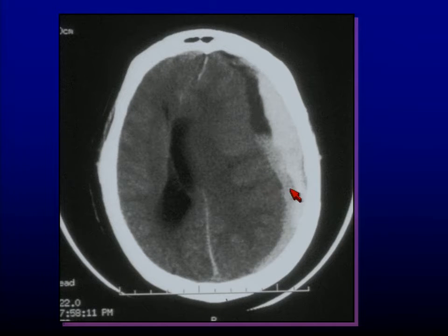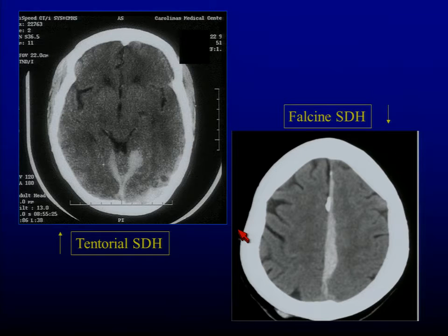But then they fell again, and they now have an acute subdural on top of it. So is their blood subdural, both acute and chronic? What's it doing? Well, unfortunately, this is the left lateral ventricle. This is the right lateral ventricle. This is midline right here, or this is what they're supposed to be. So they survived this one okay, but with this one on top of it, they had a horrible outcome because you can tell this brain is so unhappy.